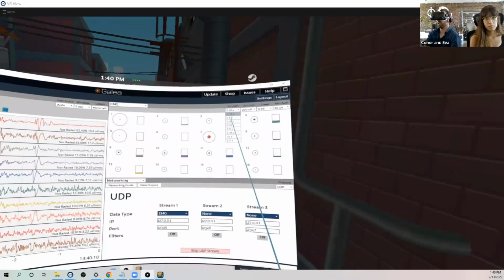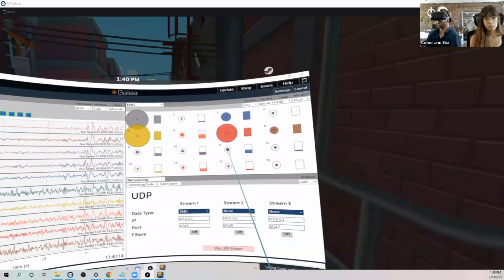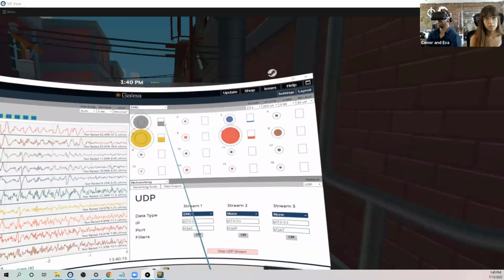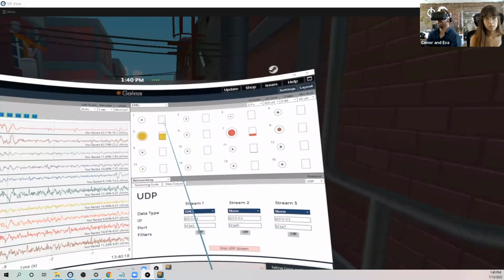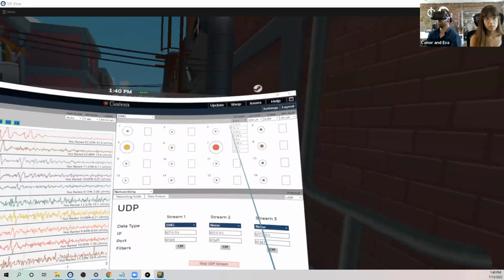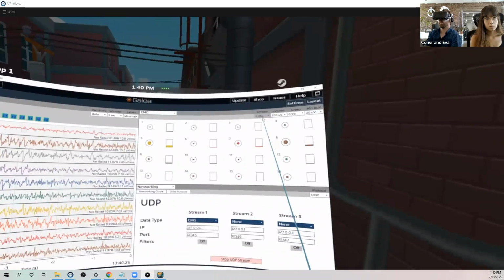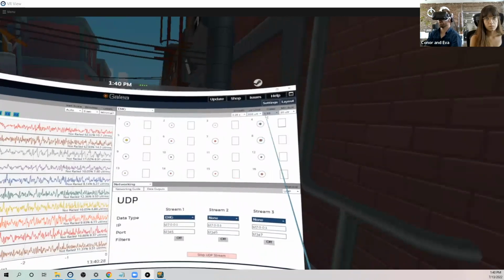Whereas if I go to the other end, let's say 2 seconds, and activate the left cheek a bunch of times, it fills up that bar, and then it really slowly unfills. It takes 2 seconds to dump the bin, basically. You can tweak this in real time. I like to keep it at about a quarter of a second. That usually seems to work the best for me.